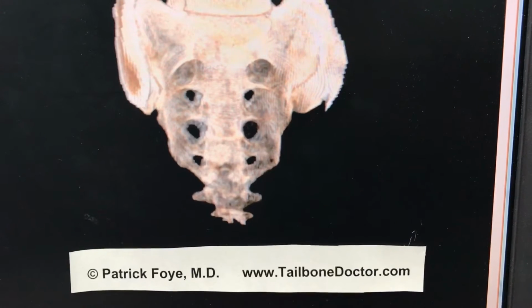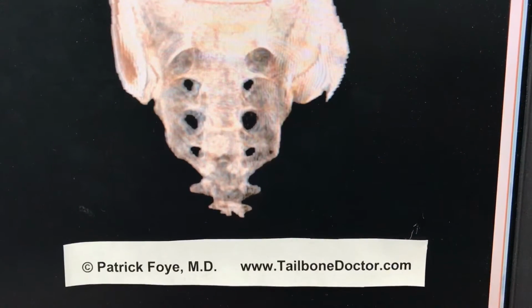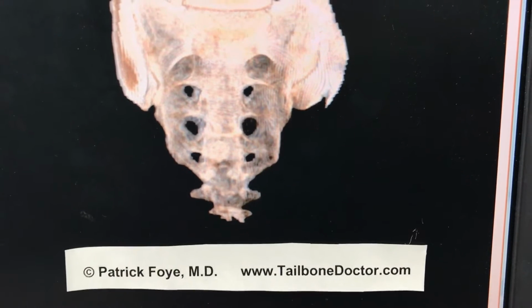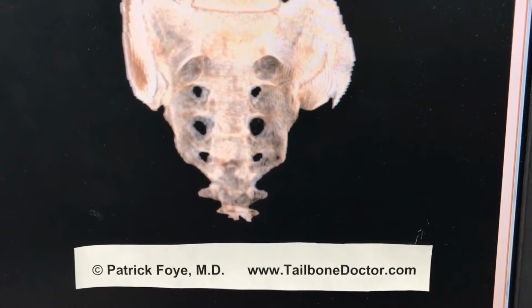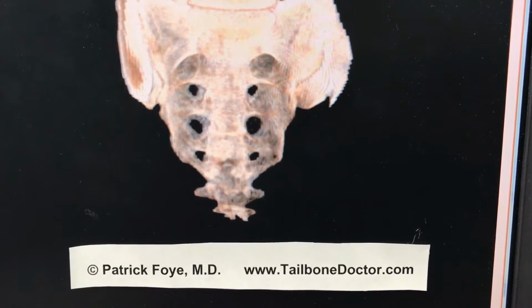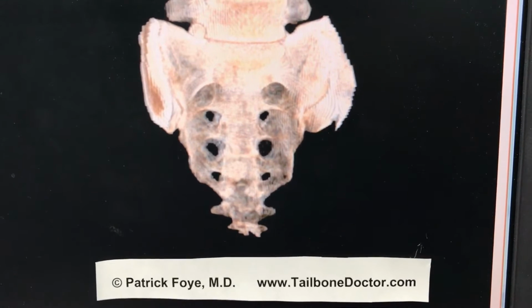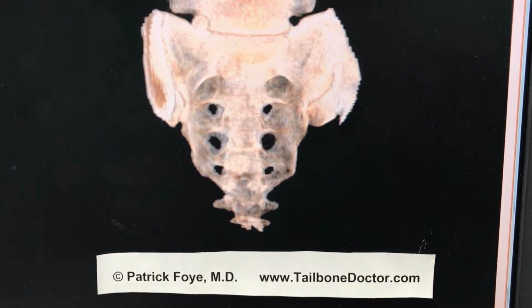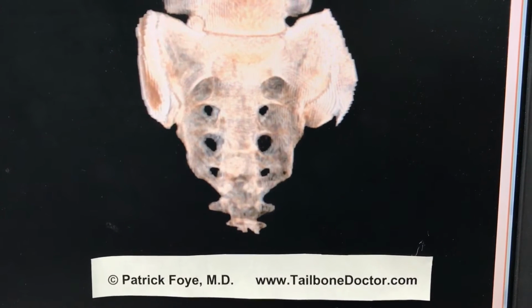And this is just a short educational video on the topic of using CT scan, CAT scan, or computerized tomography scanning in the evaluation of patients with tailbone pain, and specifically the idea of using CT scan with three-dimensional reconstruction, which is what we're looking at here for this particular individual.